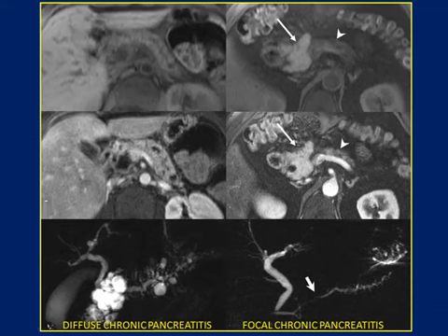It is also important to note that these images have to be compared with the axial images, where we see the extensive involvement of the pancreatic parenchyma, which appears hypointense on this T1 weighted FATSAT image due to the fibrotic evolution of the pancreatic parenchyma.